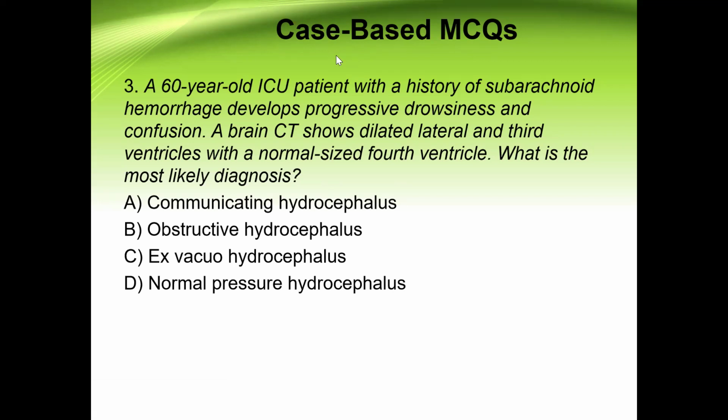That is what I want us to change here. That's why I'm bringing this here. If you're working in ICU, you should have the basics of brain CT interpretation. You are the first person they will send the scan to, before even the neurosurgeon comes, especially in ICU. So, good answer, correct answer. Let's look at the fourth one.